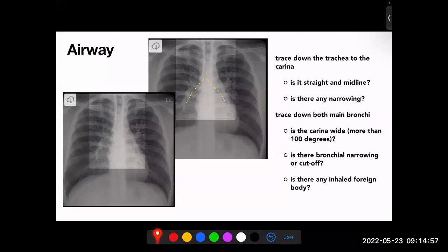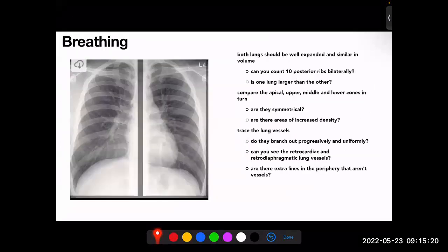So why I'm putting these pictures this way is so that you have a systematic way. The first X-ray, when you look at it, your eyes should go to the trachea first. Before you do anything else, is the trachea central? Are there normal left and right bronchial bifurcations? Is there a foreign body? No, you move to the next. Next thing, you look at the breathing.